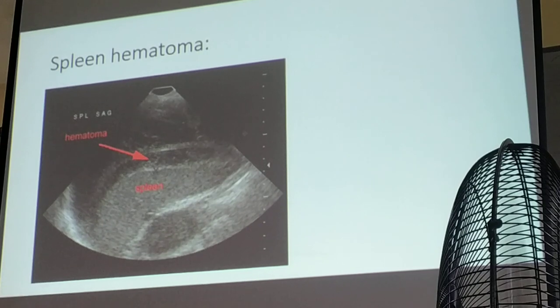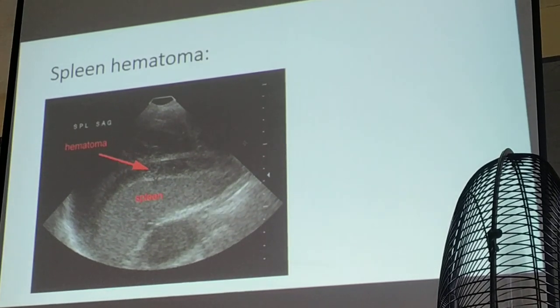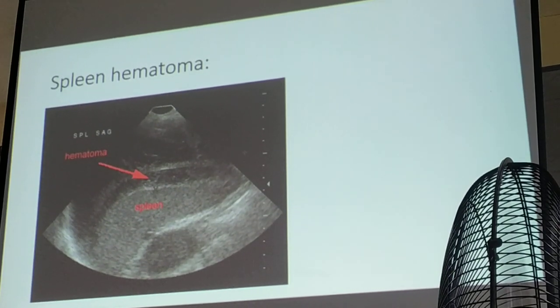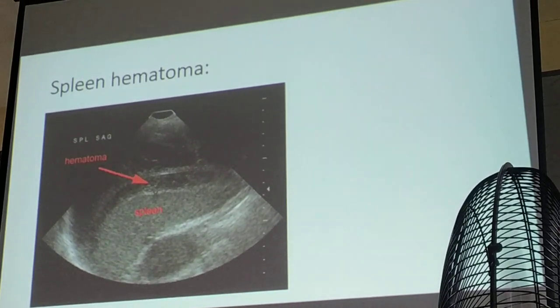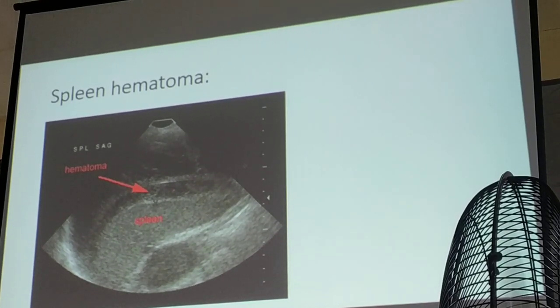Okay? This one would be your hematoma. Causes of your hematoma? Trauma. That's why we do fast ultrasound.